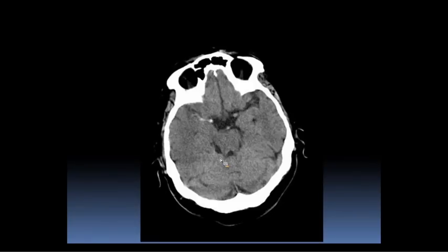Okay, what side is the infarct on here? I don't know, for some reason, all of my cases have right-sided infarcts, except the last one. So it's here, and I think there probably are some changes here, loss of gray-white matter differentiation, some mild hypodensity, but the real finding here is the dense vessel sign.